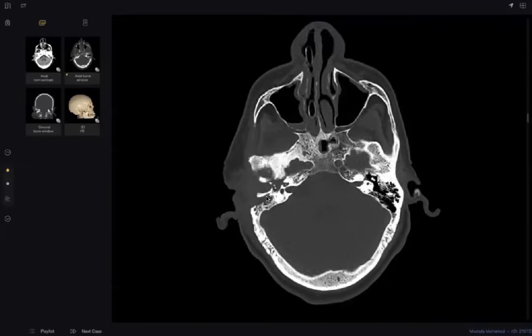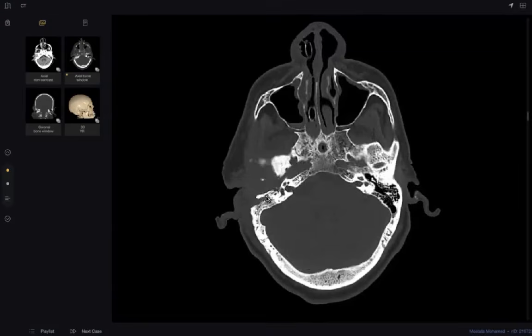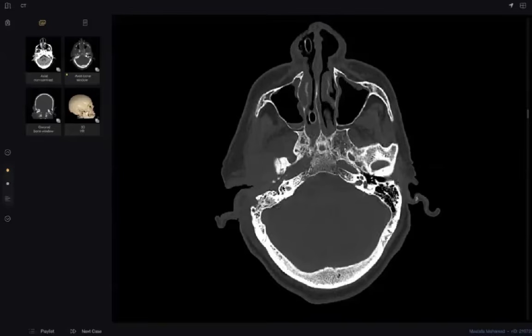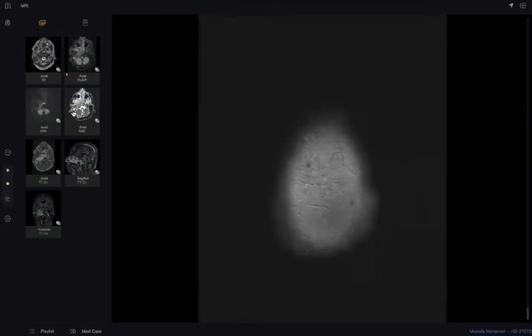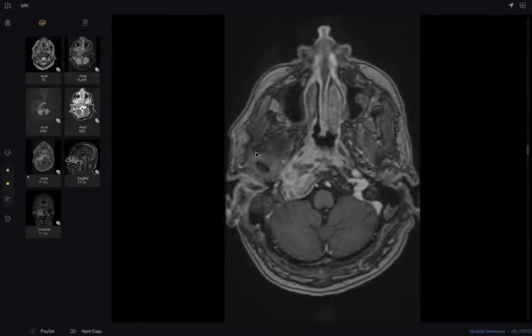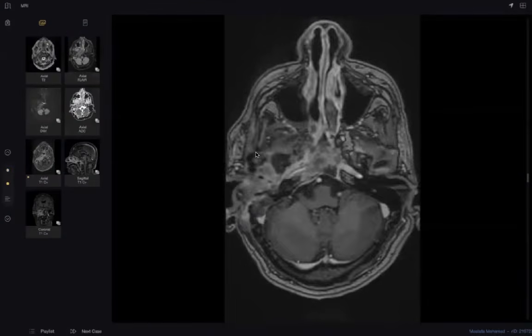If you look here, you can't detect even the foramina. The skull base foramina here are completely destroyed in comparison to the contralateral side. This is the foramen ovale, and here there is no foramen ovale. Just posterior to the lateral is the foramen spinosum. Here you can't detect any of them. Our doctor asked for this post-contrast. What happened here?